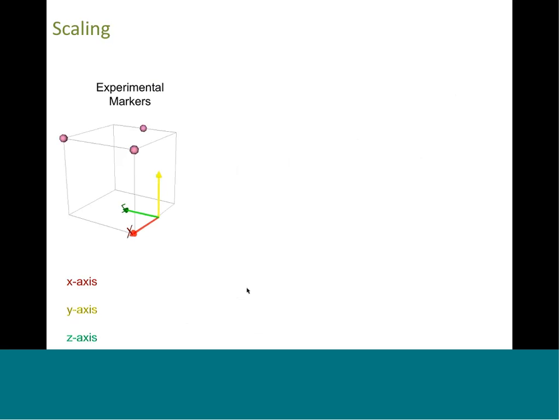We're going to discuss our best practices for scaling the four main bodies of the lower limb, but beforehand, we want to start with our simpler example. So we're going to start by explaining how we would scale a rectangular prism.